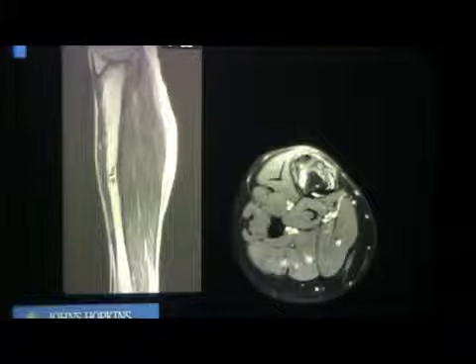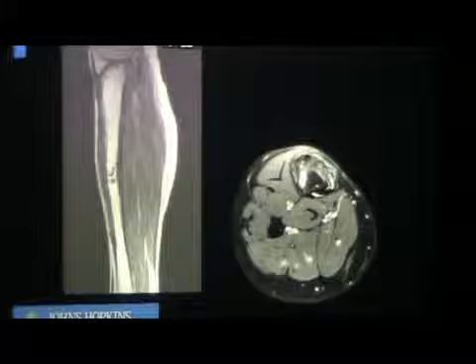And that's another cortical lesion you should remember. Thickening of the cortex. On T2 images, all the infiltration in the cortex. Okay, so what is that? Paget's, right? So this is that blade of grass on the nuke scan, blade of grass. Okay, very sharp marginated. Usually when you have long lesions, think benign. Okay, when you have long bizarre lesions, think of Paget's, think of fibrous dysplasia, think of neurofibromatosis. Those are the three main categories for long bizarre lesions like this. Okay, we are not thinking malignant here.